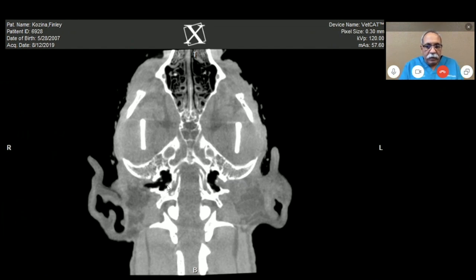What we are looking at mainly when we see the ear CT is, number one, the bony structure, and number two, the air in the middle ear. The middle ear is all filled with air, and anytime there is a problem, the air gets replaced by either tissue, fluid, bony structure, or a tumor, something that fills it up. So you want to look at the air positioning in the middle ear.